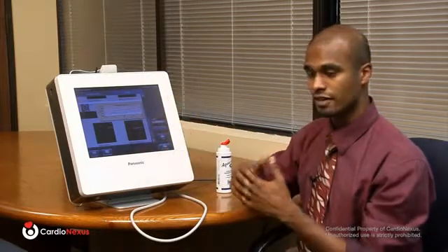The third and fourth pages of the report aren't presented here. They're simply information, more text that the patient can understand. And the last page of the report is a blank physician's comment page that he can write in any comments and then sign at the very bottom.